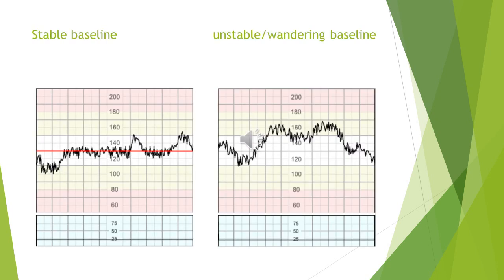Another area of importance is the difference between a stable baseline and a wandering baseline. Please, a wandering baseline is not a normal baseline, yet you don't need to act, you don't need to deliver now. However, you need to be closely observing this baby. Because ask yourself why this baby is hyperactive, why this baby is not resting, why he is not following the pattern.